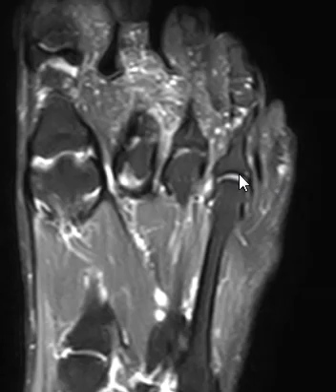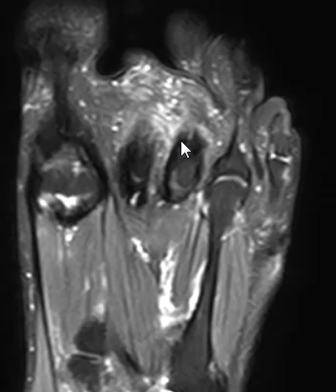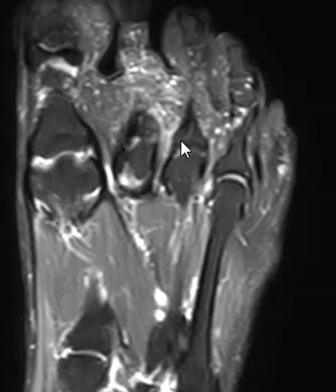On the fat suppressed images, this doesn't seem to show up as well. Sometimes it's intermediate and sometimes it's mildly hyperintense like this, but it's best seen on the T1 weighted images, where there's a sharp delineation between the fat that's really bright and then the Morton's neuroma that's really intermediate to dark.